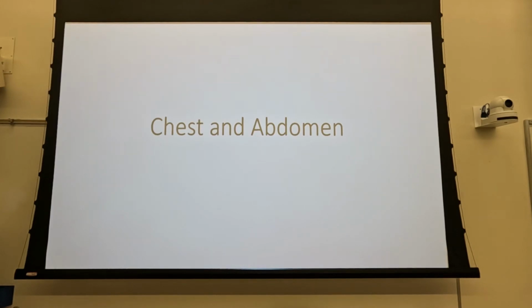I don't know what it is, but we didn't get it right. So we're going to go back in and we did exactly the same thing again. And guess what we got? Same. Exactly the same image. And what we forgot to do was elevate the arms. That's the embarrassing part, right? So we shot this lateral chest X-ray 3 times, because twice we forgot to elevate the arms.